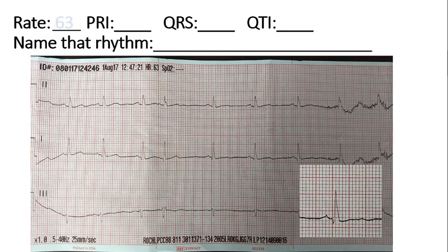So what's going on here? You have a fairly regular rhythm, but just to the left of the center of the page, you see one complex. It looks like the others, but it's a little bit closer. Maybe something fired a little bit early. So what happened here?